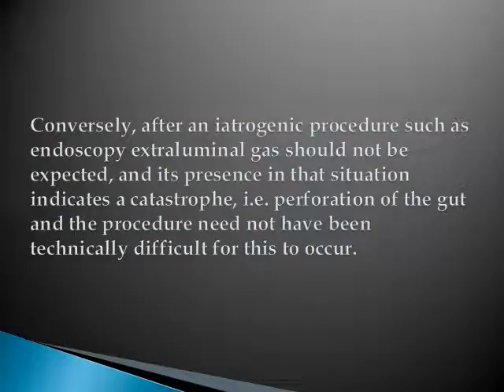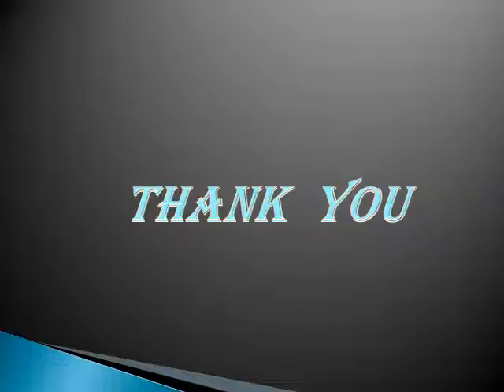Conversely, after an iatrogenic procedure such as endoscopy, extraluminal gas should not be expected, and its presence in that situation indicates a catastrophe, that is, perforation of the gut, and the procedure need not have been technically difficult for this to occur. With this, we come to an end.